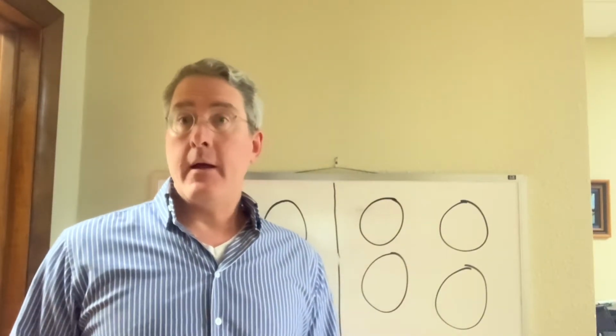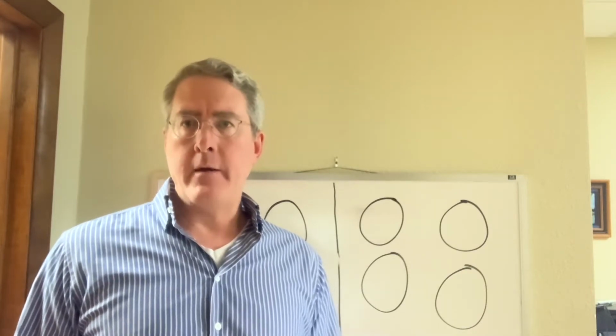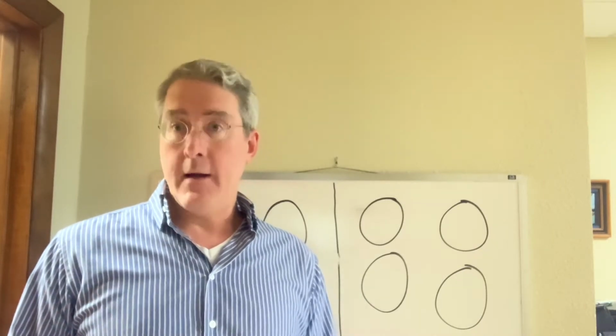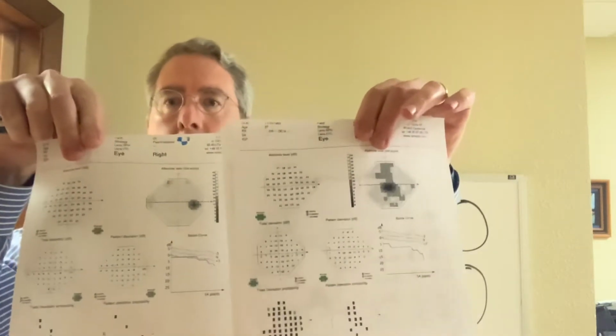I'm Dr. Adams, and I'm a pediatric ophthalmologist in Albuquerque, and I want to do a brief video on visual fields. This is more geared towards medical students and, say, family practice residents or internal medicine residents. So ophthalmologists obviously spend a lot of time with visual fields, and we get excited about them. I did this one today, and, for example, on the right side, it's normal, and on the left side there's this central scotoma.